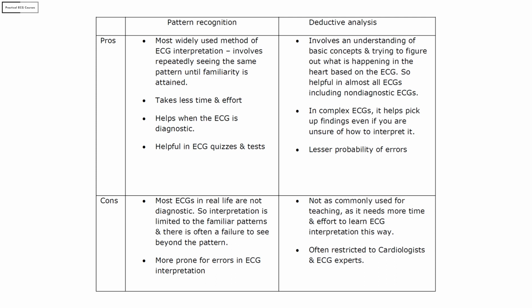As you can see, the only disadvantage of concept-based ECG teaching is that it takes time. Explaining concepts takes time and you can't rush it. Look at this session itself. It's already around 30 minutes just to explain one ECG. If I had to teach HCM ECG using only pattern recognition, it would have taken me less than 5 minutes in total. Even though it took me 30 minutes to explain one ECG, because I use a concept-based approach to teach it, I could cover a lot of related but important points from different topics.